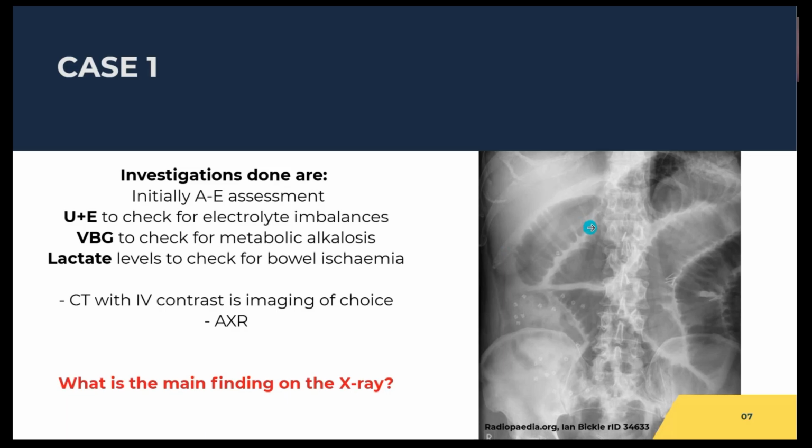Is there any specific finding that you can see on this X-ray? Okay, distended bowels, yes. There's a certain name for these lines. Okay, perfect, Sophie.